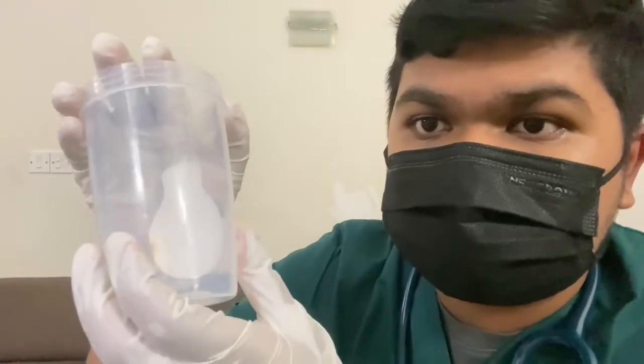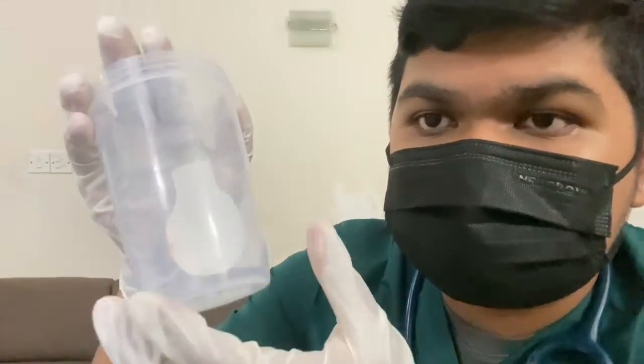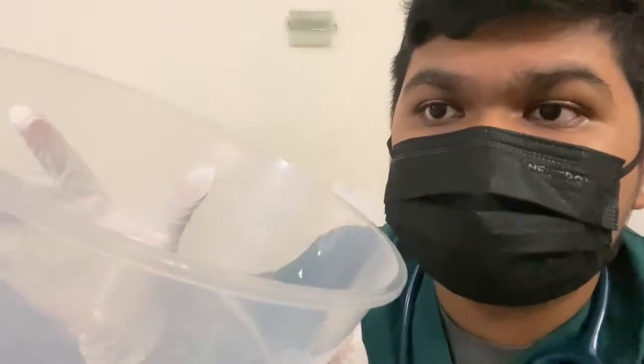So now, let's continue back with the instrument list. Next up, we have the urinal or bottle. Usually, it would be bigger and longer to hold more volume, but this is the only cup I have. And we do not forget the all-important bedpan that will be used to collect the urine from bedridden patients.